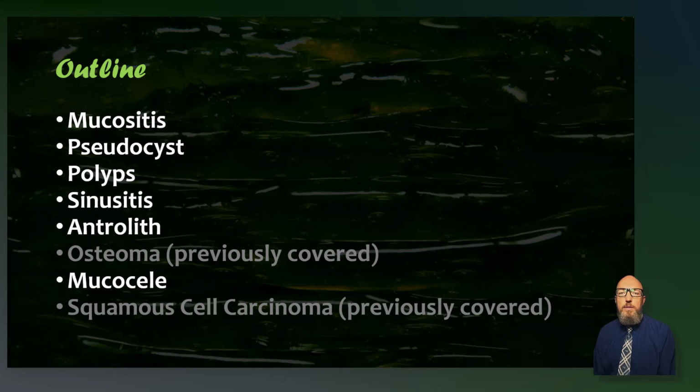And keep one principle in mind as we go through this. In health, the sinus is filled with air, and air reads black on a radiograph, especially in a CBCT. Every condition is a departure from that black, and your task is to name the departure precisely, because the name determines what you do next. Ignore it, treat it, refer it. And one rule, which we'll build toward in the second video, overrides all the naming: an opacified sinus with destroyed bony borders is a malignancy until proven otherwise, so keep that in mind.